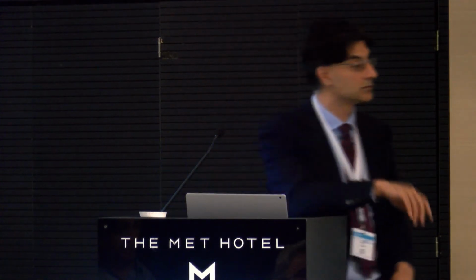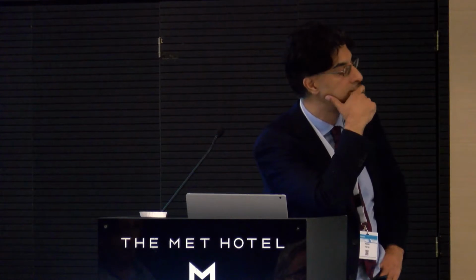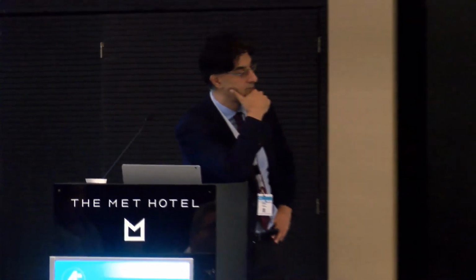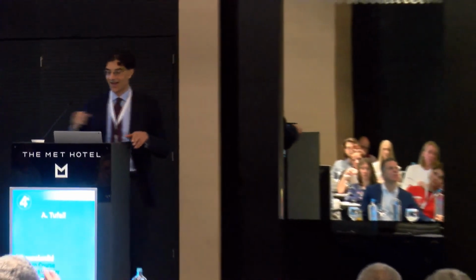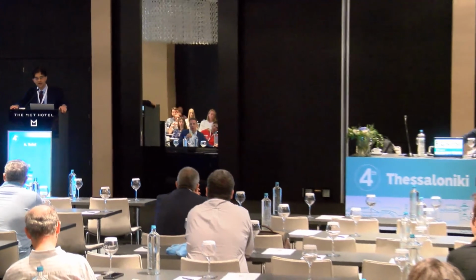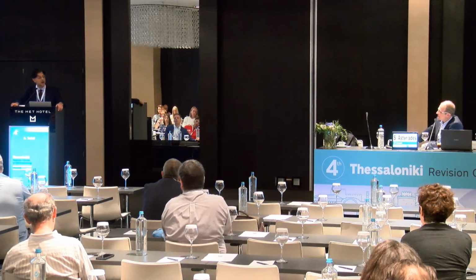Yeah. Good. You've got serous PED and subretinal fluid. You do everything, ICGs, etc. No signs of leakage or any signs of neovascularization. What do you do on those? It's a nightmare. Considering the fact that you've got all these clinics at Moorfields and in the UK, it's very, very difficult.